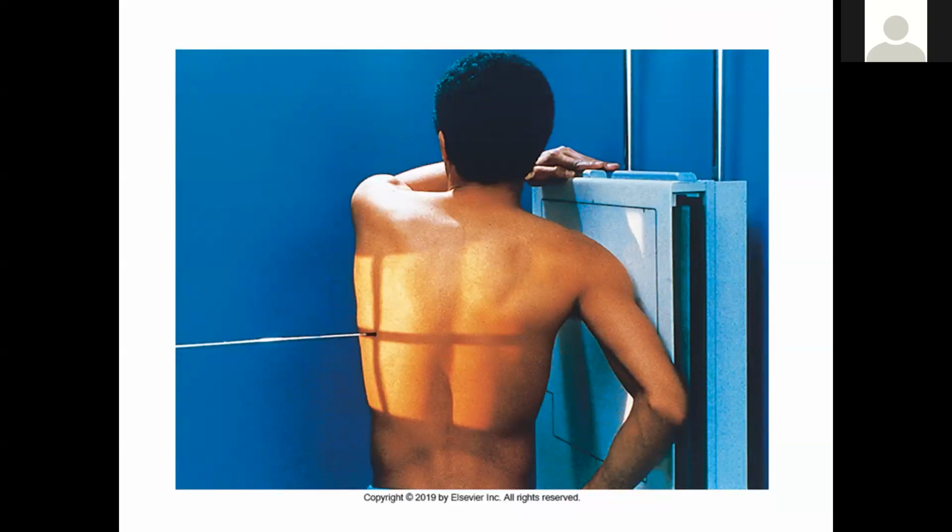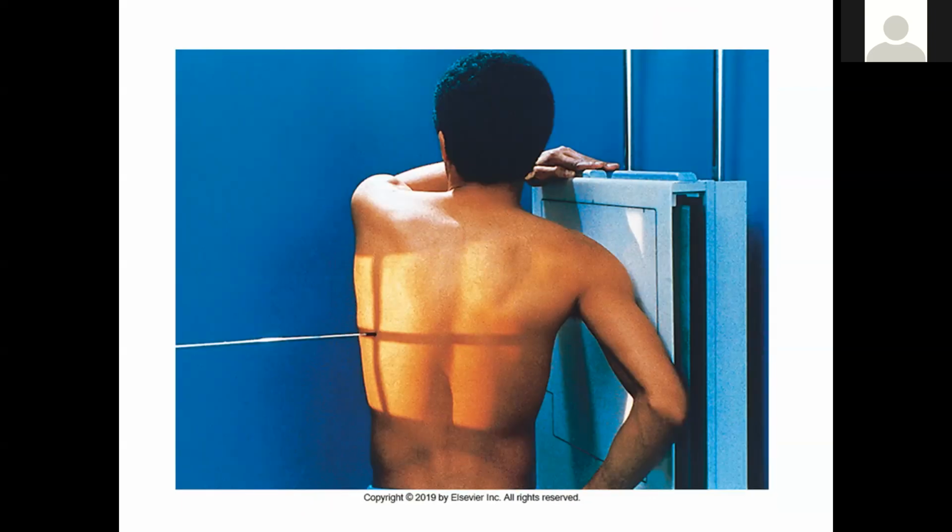Now this is a PA oblique. Your patient in this case is in an RAO position, and the information will be very similar to this projection. So RAO, patient against the bucky. The ribs that are against the bucky will be foreshortened. The ribs that are pulled away from the bucky when the patient is facing it will be elongated.